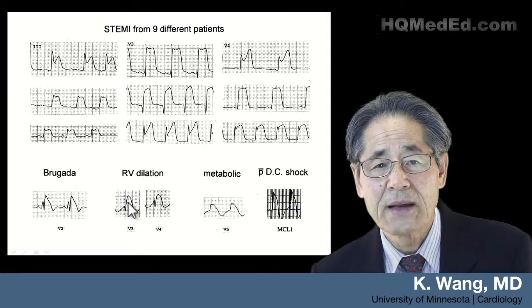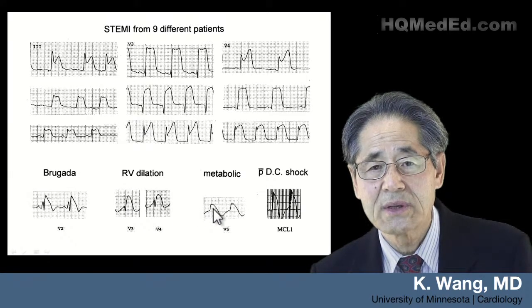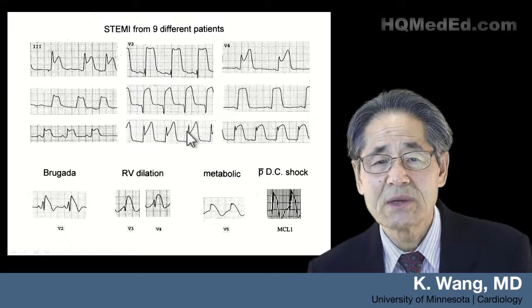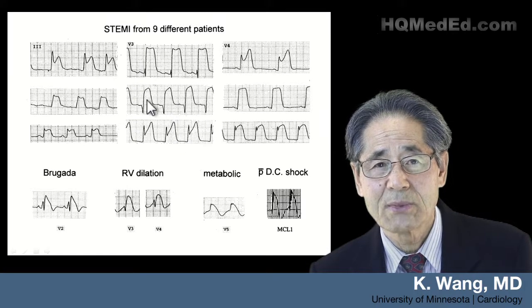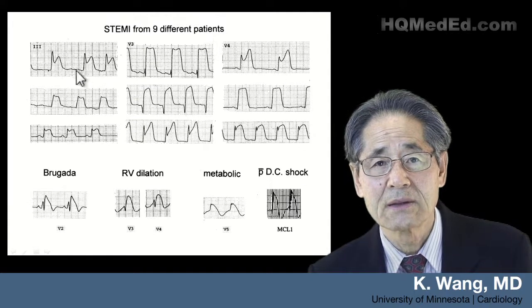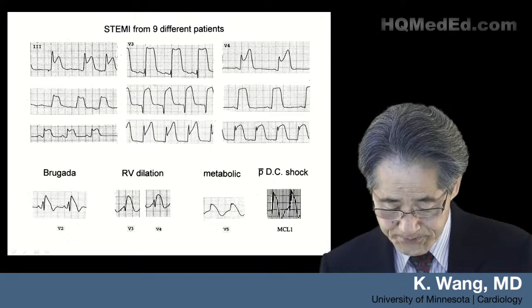inverted T. ST segment begins from the top of the R prime, continuously downsloping. ST segment begins from the top of the R, continuously downsloping. Same thing here. So I hope you will appreciate the difference between STEMI, very much elevated STEMI with the ST segment as tall as the height of the R wave, but still different from these kind and these, from 9 different patients who had the STEMI.